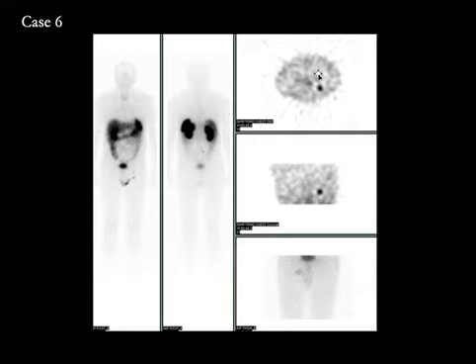So here on SPECT transaxial image, there is intense uptake in the left lung nodule, seen here also on the coronal image, and the bottom right image is a spot view which was taken after cleaning the patient and getting rid of all this other activity that is seen in the region of the perineum. So metastatic disease to the lungs.